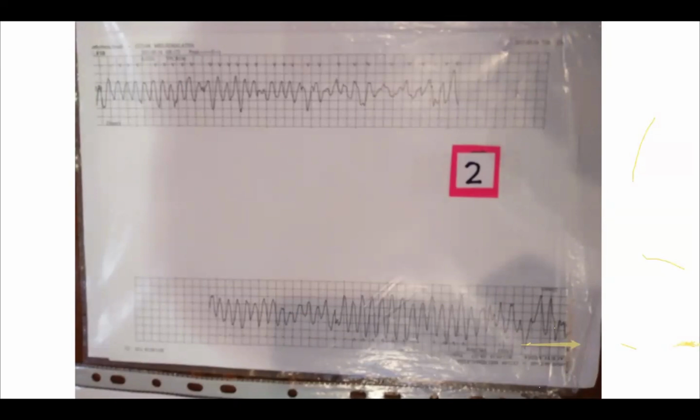Polymorphic VT. So the lower one, you can jolly well say that it's a polymorphic VT, isn't it? The upper one, you can mention it too. Even if you say it's ventricular fibrillation, I will buy it, because it's so deranged. But remember, whatsoever these abnormalities are, they are very, very highly unstable, right?